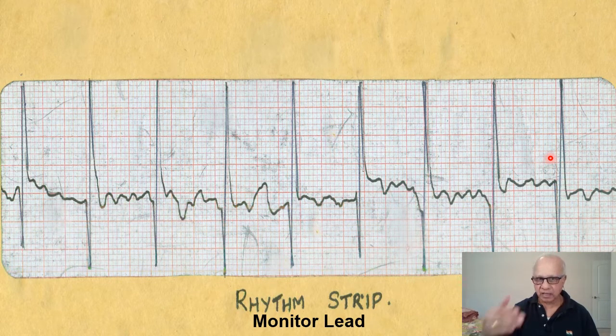Now the next part of my question was, what do you think is the underlying disease in this patient? Now if you look carefully, the fibrillary waves are very coarse. You can see, isn't it? They are very coarse fibrillary waves, and the fluctuations are more than 1 millimeter in amplitude. When it is so, you call it a coarse atrial fibrillation. And the classical condition where you get coarse atrial fibrillation is when the atria, right and left or either of the atria, are enlarged. And classically in this patient it was due to rheumatic valvular heart disease, for which he was on treatment in this hospital.